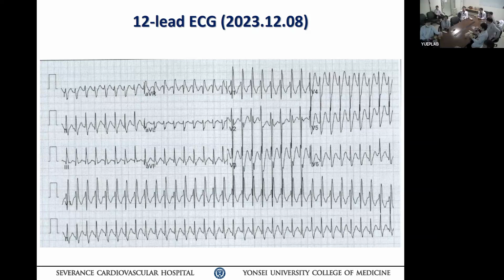영진 선생님이 할 말이 있는 것 같습니다. Okay. 리드 V2에서 QRS 모양이 한 번씩 달라 보여가지고. That's correct. And then also in V3, your width of a QRS gets different. You see that same beat you're talking? Look at the V3, V2. Next beat. No, you passed that one.